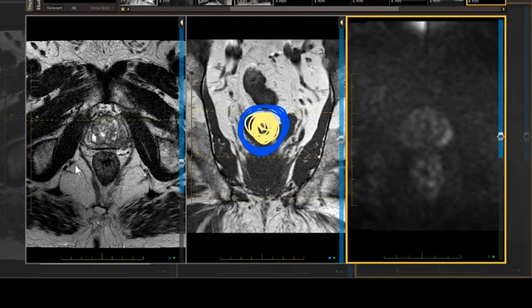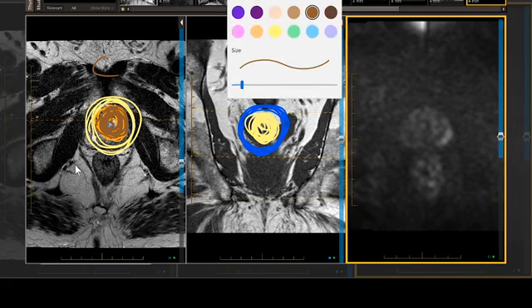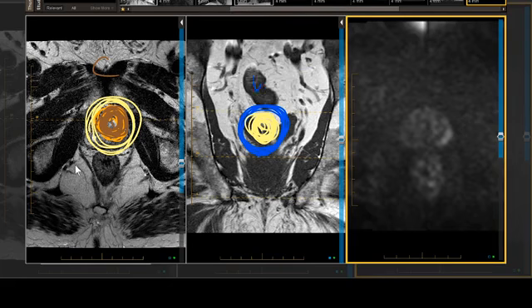We're going to have diffusion restriction on the outside, and probably less diffusion restriction on the inside, the so-called chocolate donut sign. And if you want to be a purist, maybe I should make the chocolate brown, because chocolate is brown. So this would be the tumor chocolate donut sign, and in the middle, this would be the abscess vanilla donut sign.